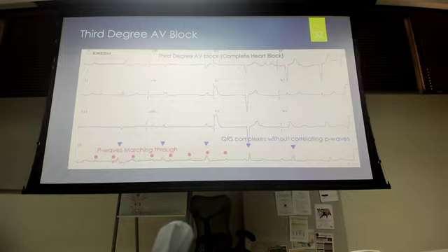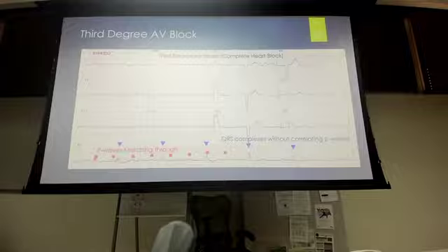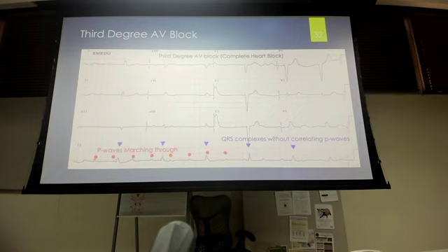So now I'm going to have to start figuring out, wait, if I have something here, let me look, maybe that's a P wave. And this is not in real life even. When you see these third degree AV blocks, you're like, wait a minute, why is this so slow? What is causing this to be so slow? If I'm going to put together my bradycardia differential diagnosis, third degree AV block is going to be on there, a second degree Wenckebach is going to be on there, and a second degree Mobitz 2 is going to be on there. On these third degrees, these patients oftentimes will have a history of either cocaine use or an inferior MI. It's going to knock out that AV node.